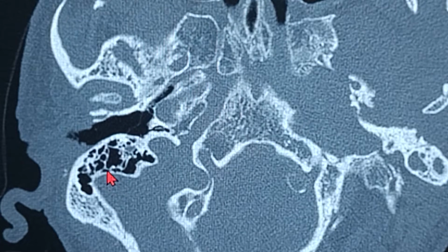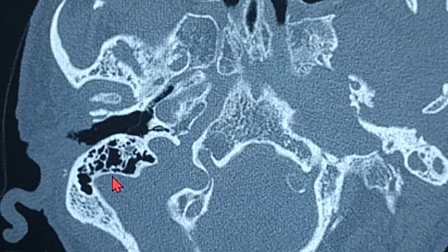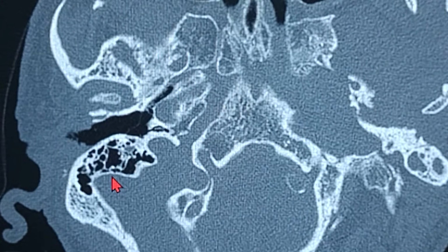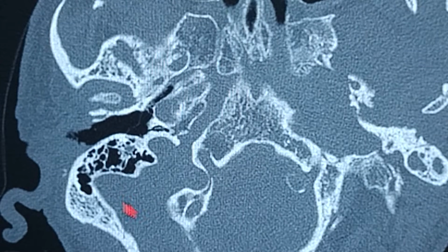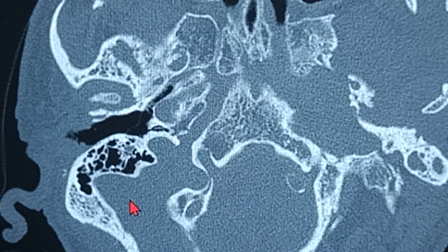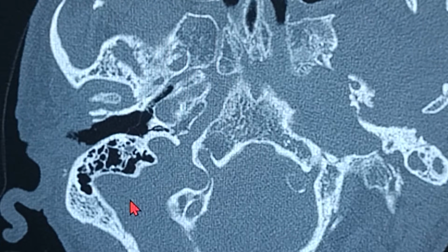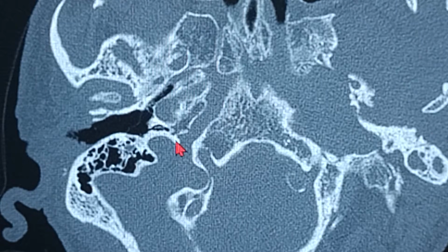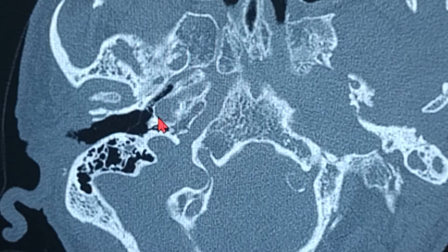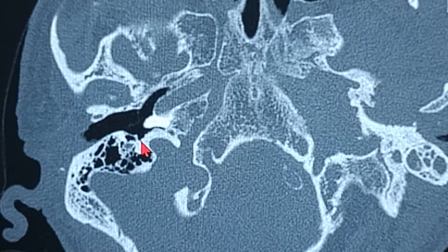If you puncture this bone and there's bleeding, you have to use a lot of hemostatic methods to stop the bleeding. So this is the sigmoid sinus area. On a CT scan, the sigmoid sinus is on a very lower aspect. So on the lower aspect, we have three structures: the sigmoid sinus, the IJV, that's the jugular fossa, and the internal carotid artery. The round window, we can see the round window niche over here, and the basal turn of the cochlea. So are we going up?